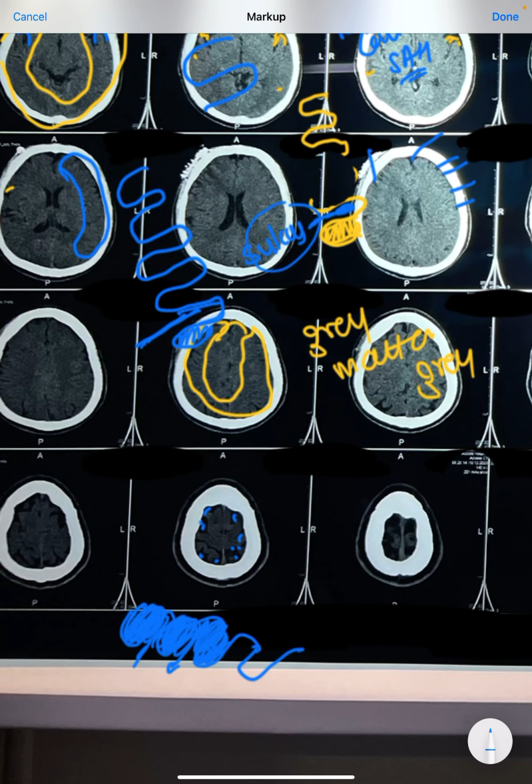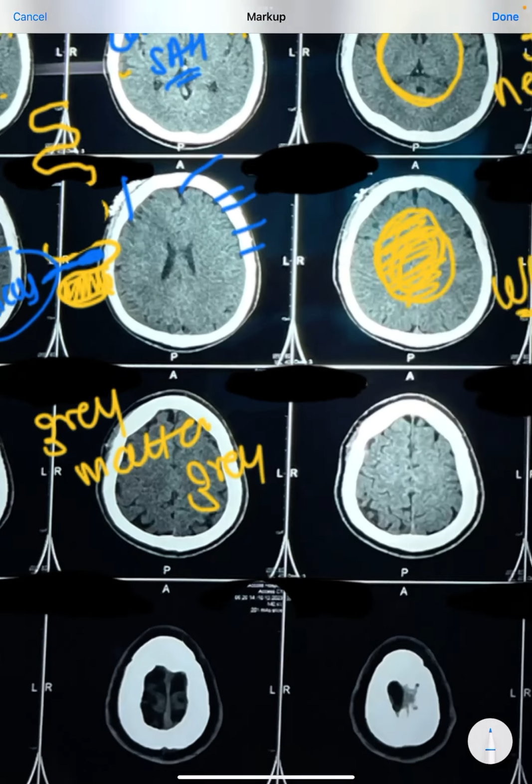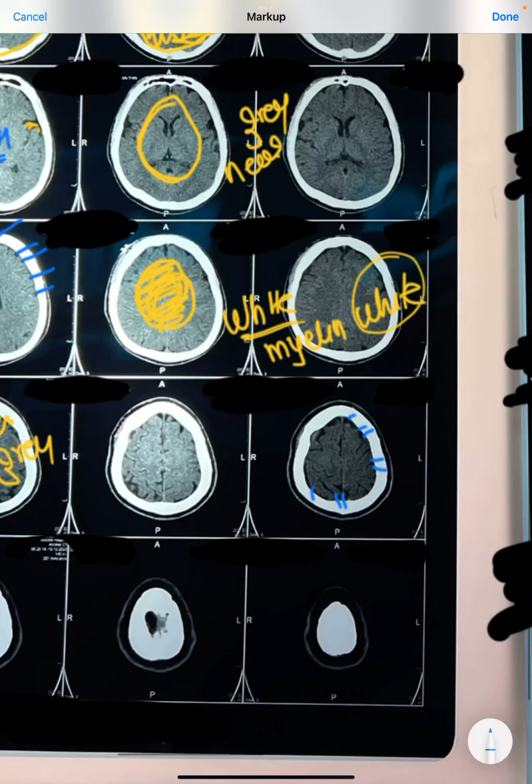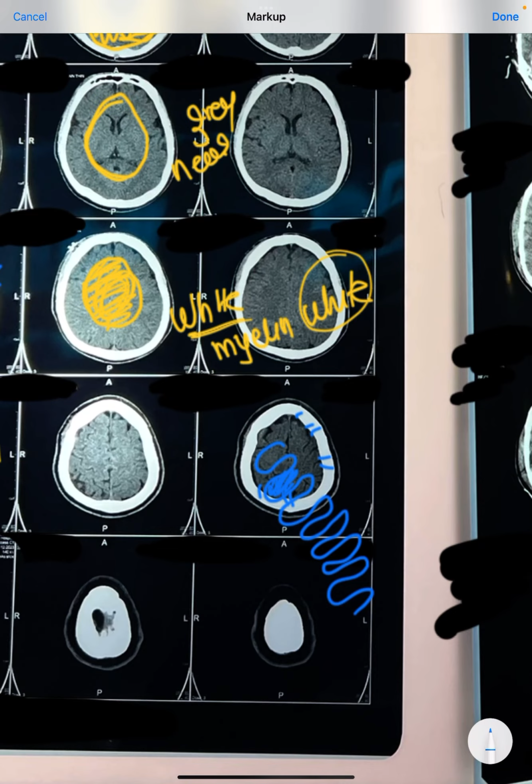So instead of the sulci appearing as radiolucent or black, they will appear radio opaque or white in color. So here the patient does not have any cerebral edema. See how good we can see the sulci. The sulci are so prominent because the gray matter, which is like this, is not swollen, and whenever it gets swollen, automatically it will compromise the sulci.